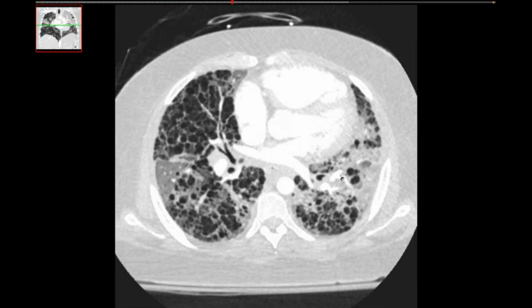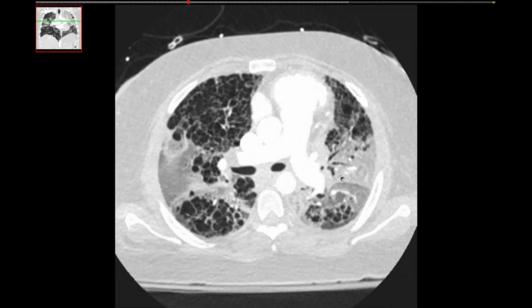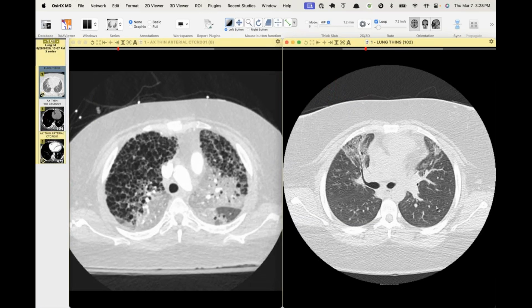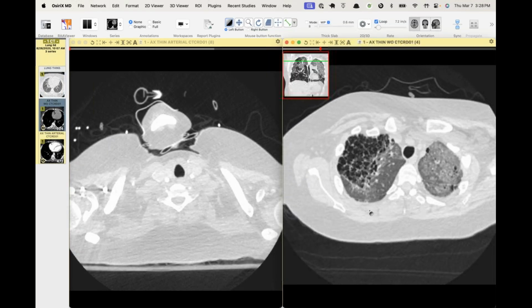I think it's diseased lung. I don't think it's preserved lung. I think it's diseased lung. It's either pneumonia or an adenocarcinoma. Yeah. I mean, relatively, compared to everything else, it's the only thing that is reasonable.